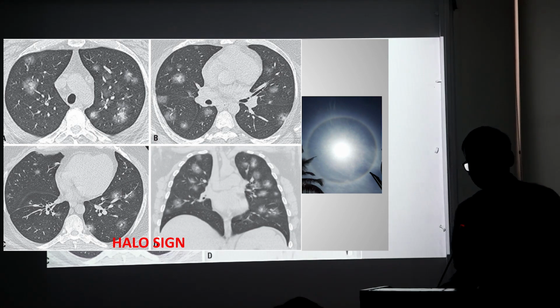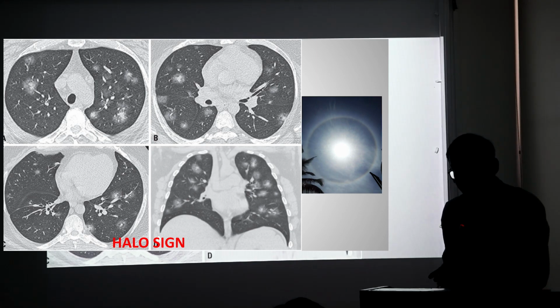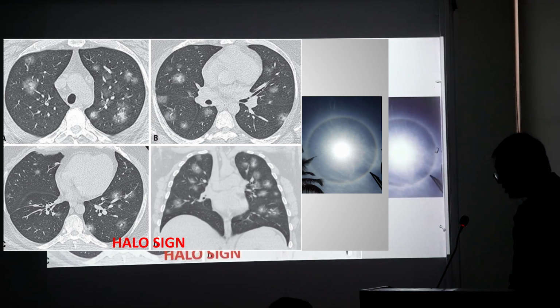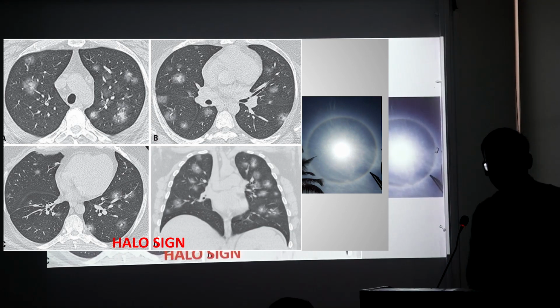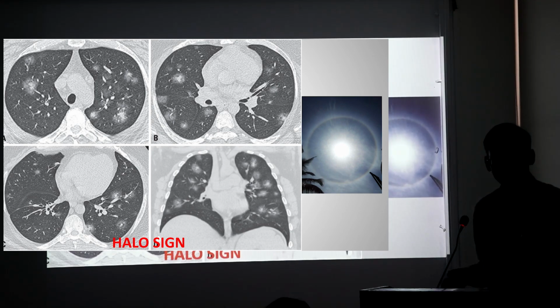Very sick patient admitted in ITU. X-ray done. X-ray is not very specific since the patient is tachypneic, not able to hold breath. He's diabetic, elderly, with very poorly controlled diabetes. What will you think of? Pardon? Yeah, absolutely. So this is the halo sign. Halo signs are suggestive of, not aspergilloma, fungal infections, fungal pneumonias. Okay.